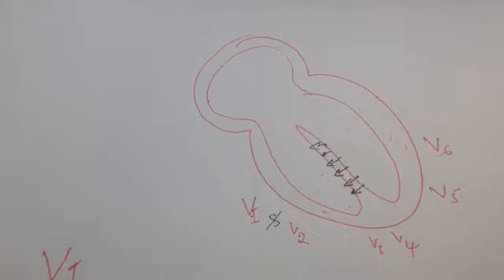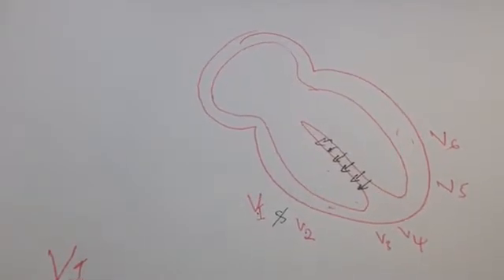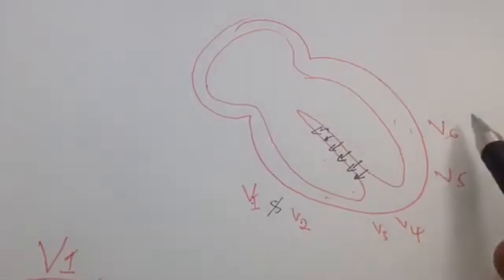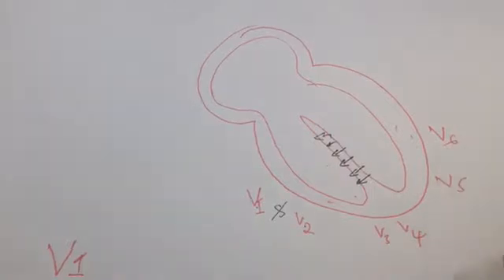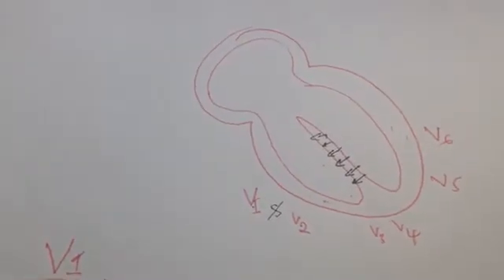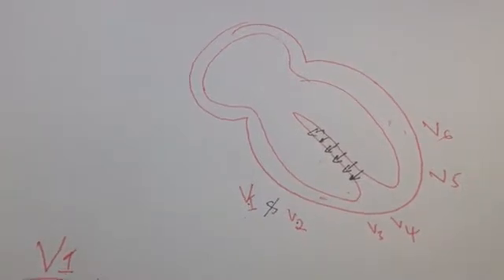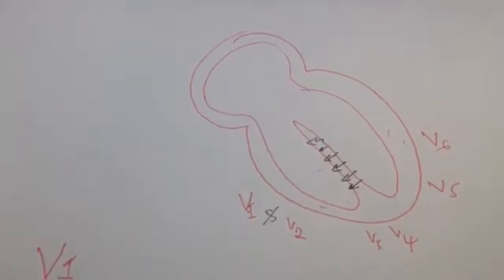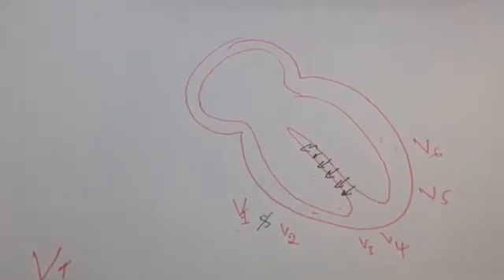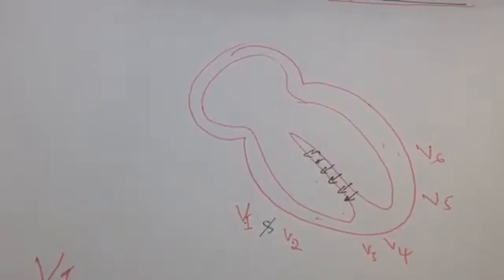If you really want to see the Q wave very prominently, you have to look at V6, and we will see why. Also, before we continue, we have to know that in any ECG pattern, the first positive deflection, that is upward, is the R wave, while the first negative deflection, that is downward movement, is the Q wave in any lead.